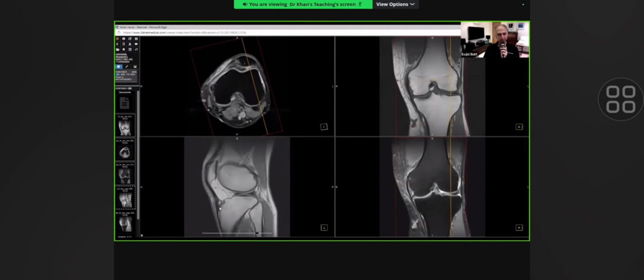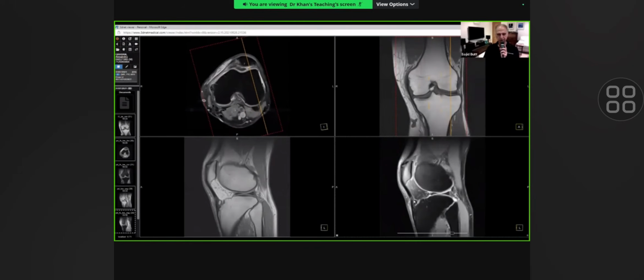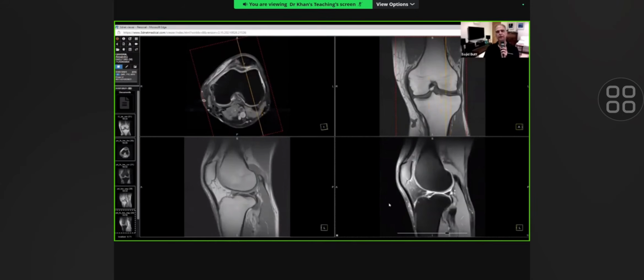in the sagittal imaging, there is a little well-formed ossicle present at the deep aspect of ligamentum patelli, but on the sagittal PD fat-sat sequence, there was no edema within this bone fragment, so it was chronic and of questionable significance. So that's one case, and that's how I would analyze them, working from one side and going to the other. I'm going to show you another case now.